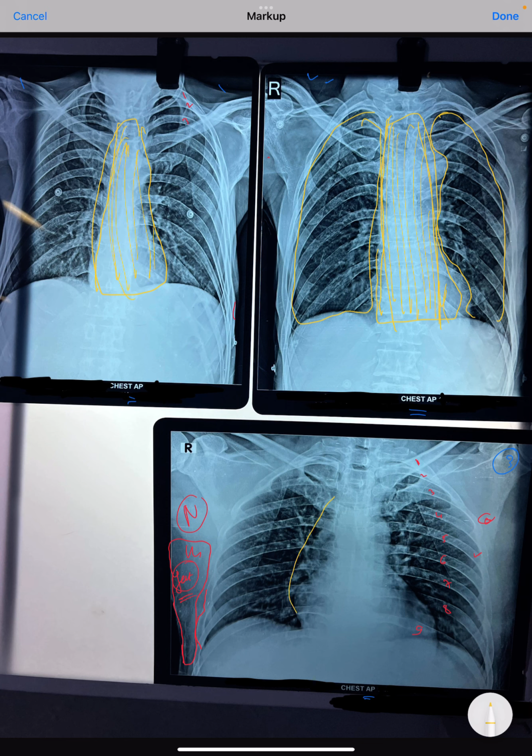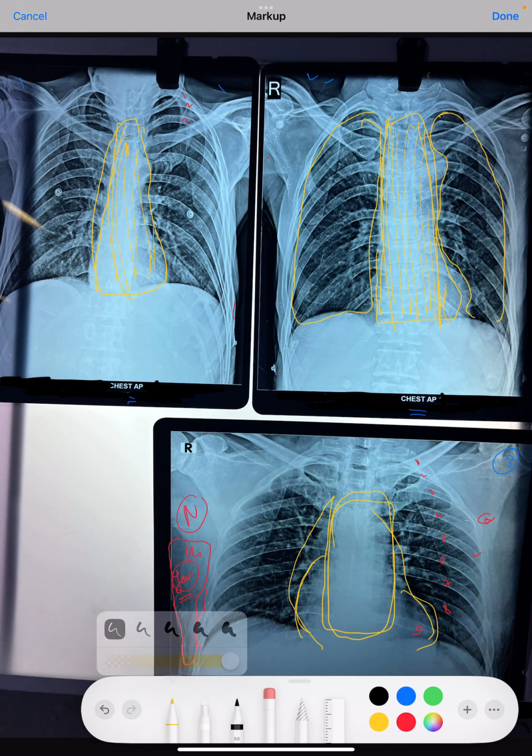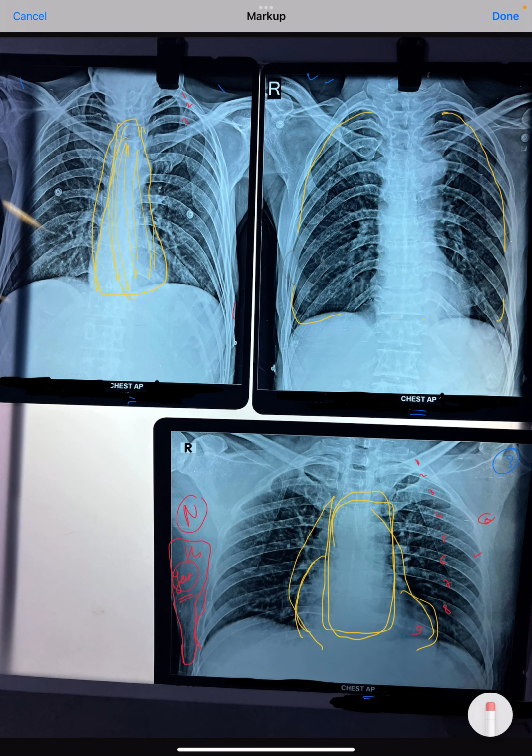Whereas compare this: the heart appears typically globular, and it has its own good space in the mediastinum. So here the heart is not tubular, and the mediastinum is not tubular. The heart has a typical right atrial border and left ventricular border, but here the heart is more compressed because of extensive hyperinflation of the lungs. So the presence of a tubular heart is one of the signs that the patient may have emphysema.